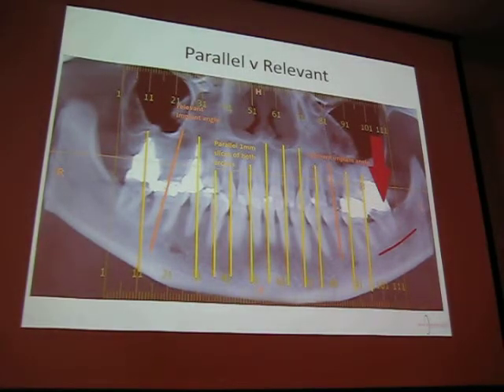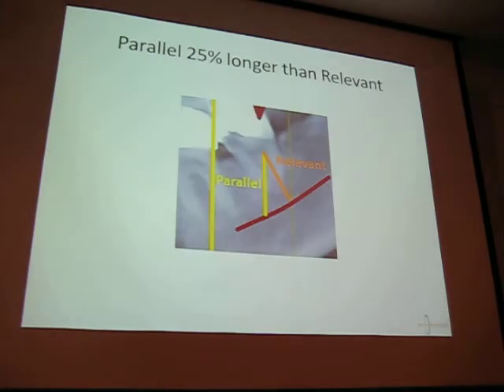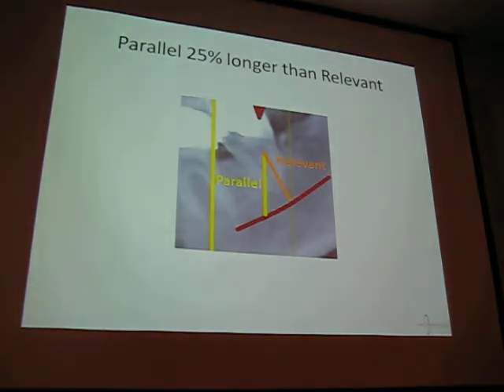And let's say, looking at this case, we have a couple different implant angles that are divergent. And let's say we're going to extract and put another implant here. All of a sudden, the difference between this parallel slice and the relevant angle is pretty huge. We're back to pano accuracy. Even though you sent out for a CT, you did what was right.